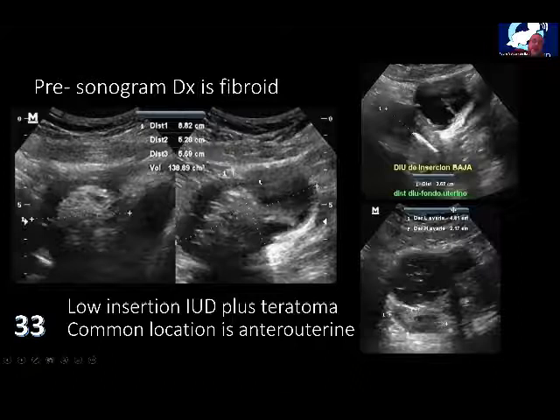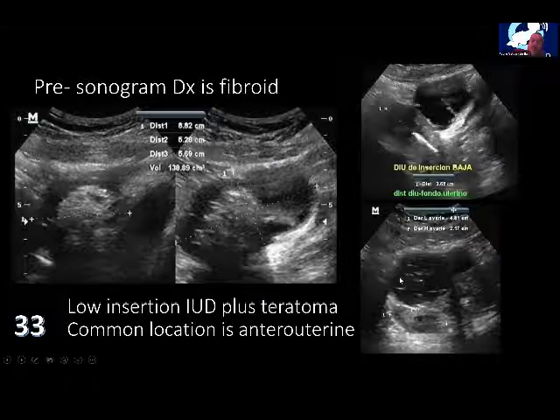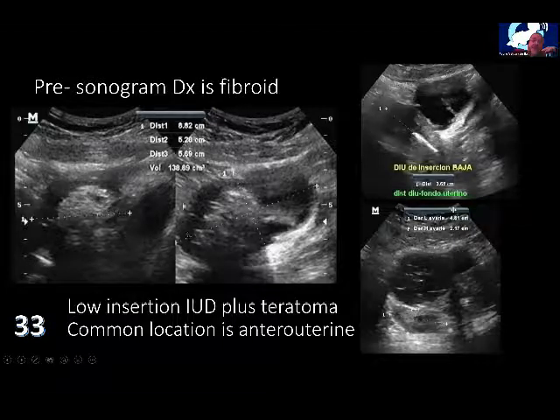After that general culture capsule, we'll talk about this patient who has been told that she had a fibroid. What she had is a pelvic mass, which is not uterine, is complex, almost 9 centimeters outside the uterus.